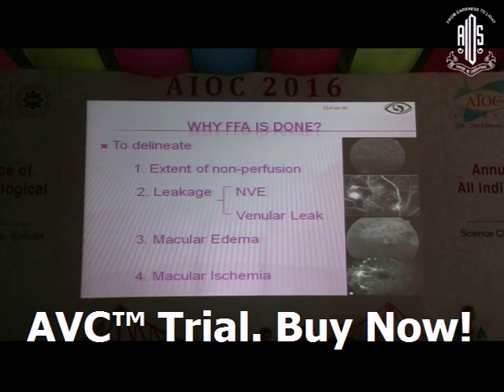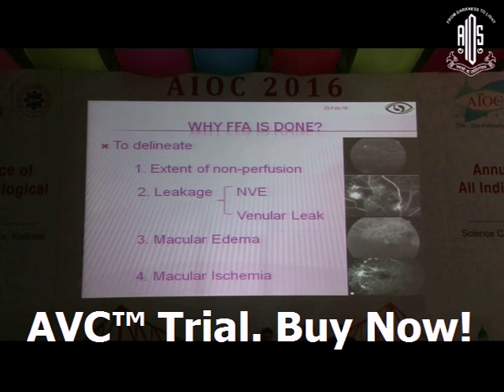So what do we want to look at? The basic thing is we want to look for the leakages, that is either because of new vessels like this, or extent of non-perfusion, that is the area because of blockage, the area which will result in ischemia leading to development of new vessels like this. Or to understand a fall in the vision which can be because of a macular edema or a macular ischemia as noted over here.